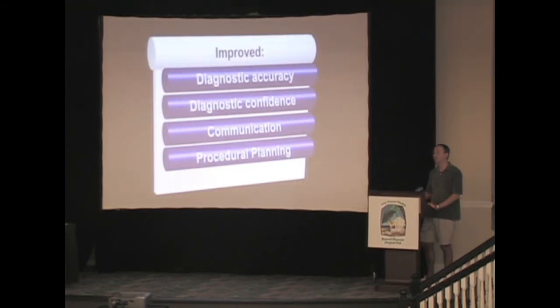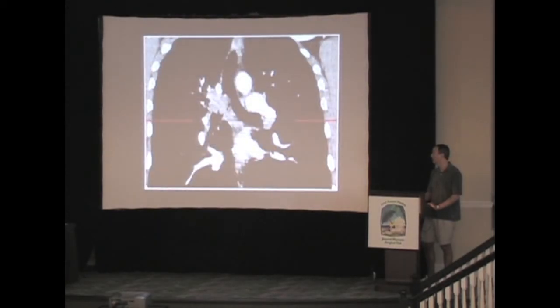So as I've tried to illustrate in the last couple of slides, these multiplanar and 3D images help to improve diagnostic accuracy, diagnostic confidence, communication, not only between me as a radiologist and you as a surgeon, but I think in turn between you and your patients, they can be a very powerful tool. And then finally, they help with procedural planning.